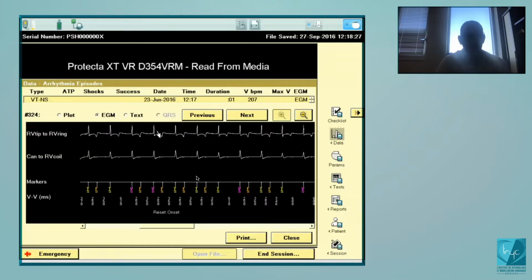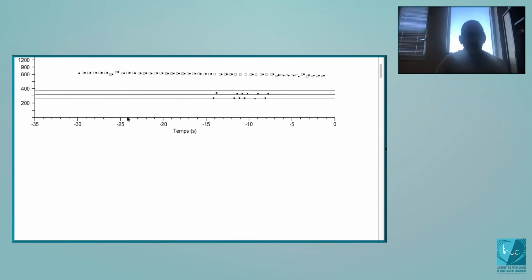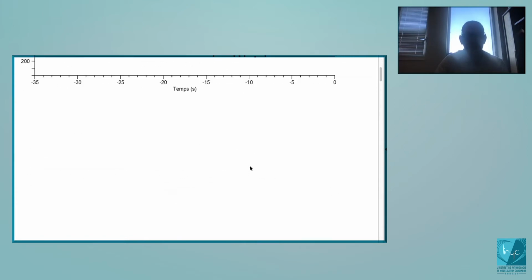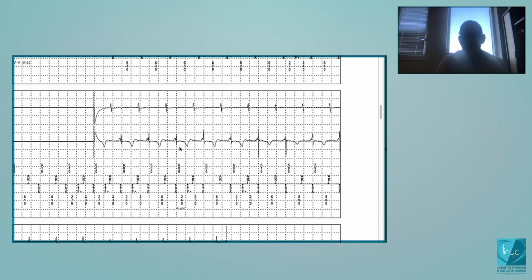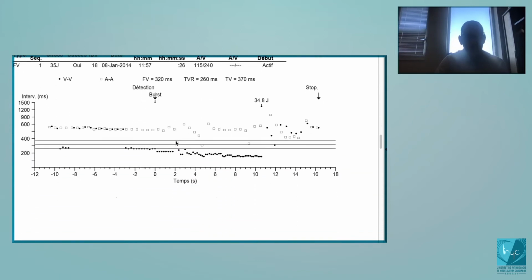So now if I share my screen, what do you think here? So this is the first patient, and you see here this tracing, the same. You see the typical aspect. And you see here, obviously, T-wave oversensing. Okay. But what happens now on this tracing?